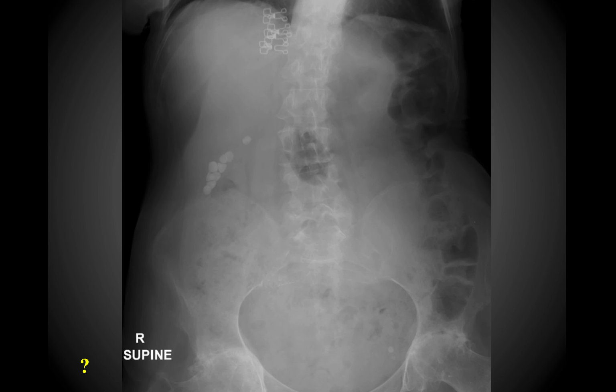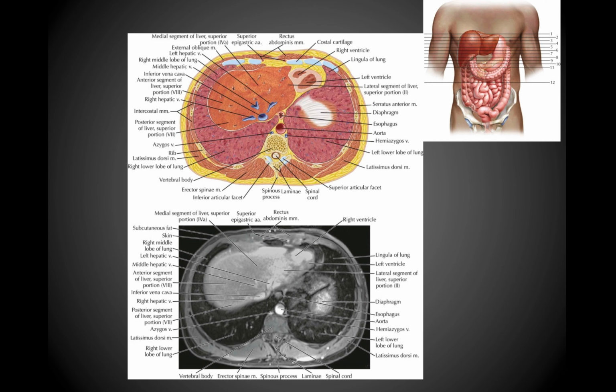In this patient, you'll notice a hyperintensity in the upper right quadrant. You can see multiple little rock-like appearances right here. Hopefully it's clear that would indicate gallstones within the gallbladder.